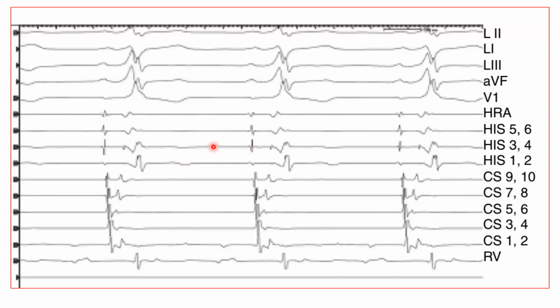Go to the His system, and look for the H. Measure the interval between A and H. A to H is normal, but the H and V interval is 0 or even minus. HV interval is 0 here, HV interval is 0 here. This is a good hint.